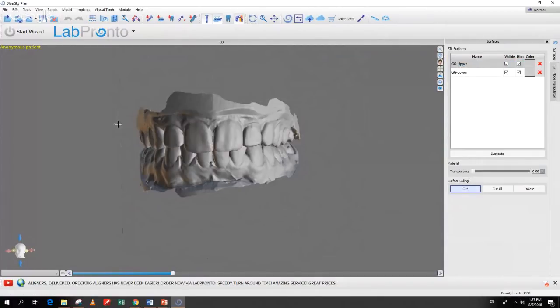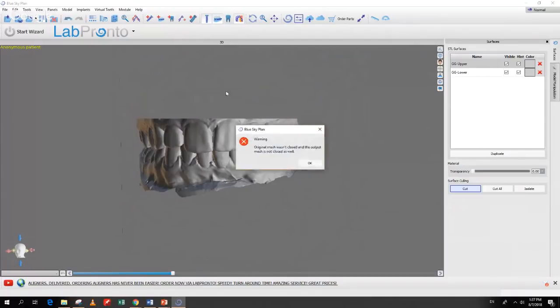We're going to find the positioning a little bit below where the teeth meet the gingiva. We're going to left click, we're going to swoop around here, and what we could do is create a very flat horizontal line, which is going to create our cut for us. And we just release the mouse button and the cut happens.